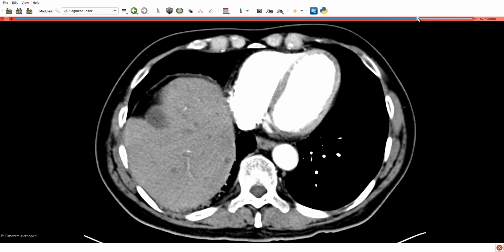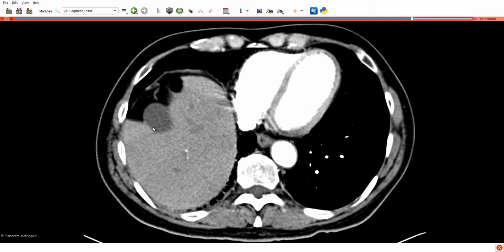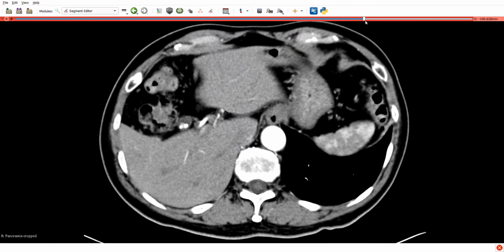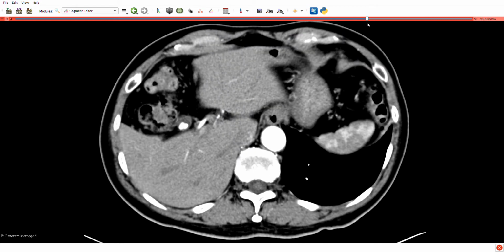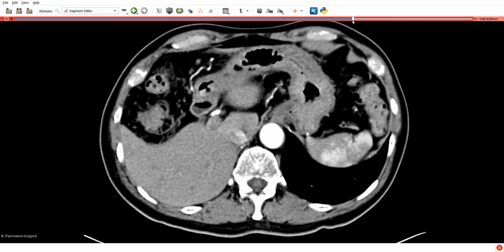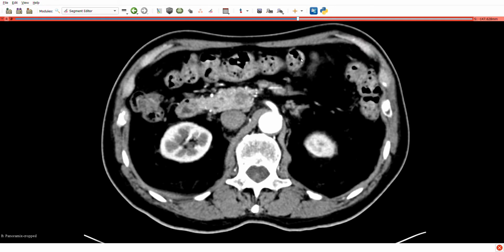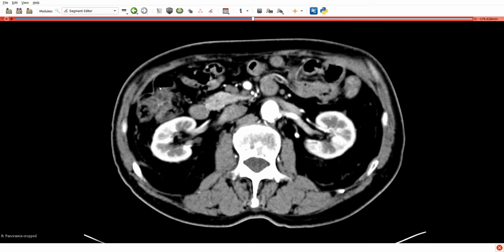So moving down through the liver, we now see starting to come into view the gallbladder here, slightly darker on a CT. And continuing to move down, we see that sitting rather close to the liver is some gas-filled bowel, and this will be the hepatic flexure of the large intestine. And as we follow that down, we see that it connects with the transverse colon here, and of course the ascending colon here.